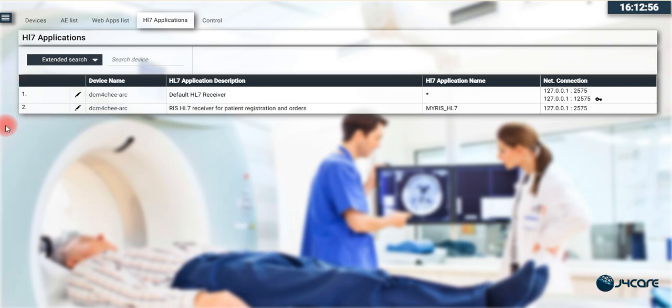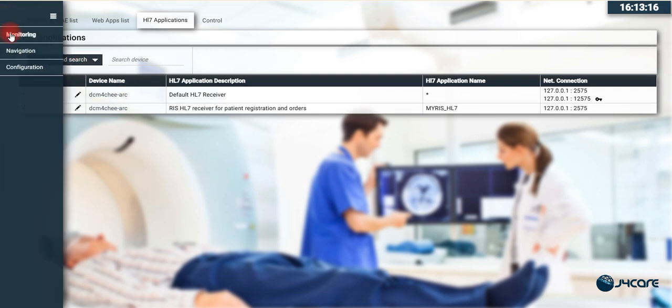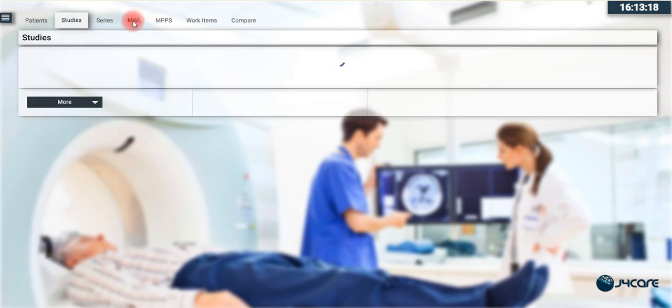For easy communication, I have developed one web page with Python, and that page can be integrated with the Radiology Information System and any other application. Or you can use that page independently to receive the data in the modality worklist. So let me show you the modality worklist page, MWL.